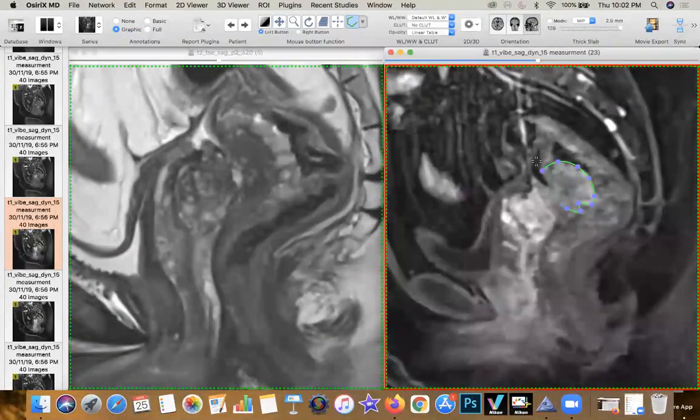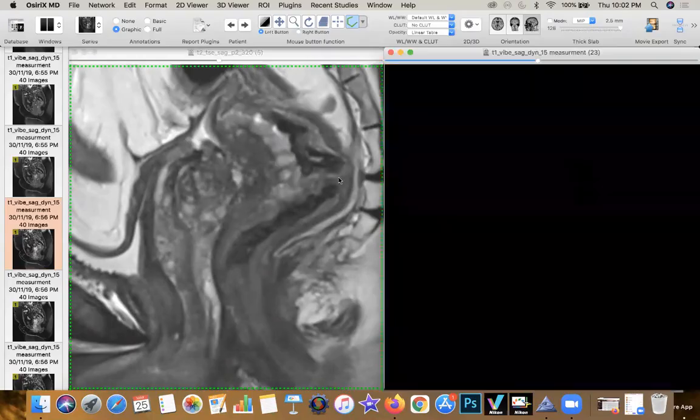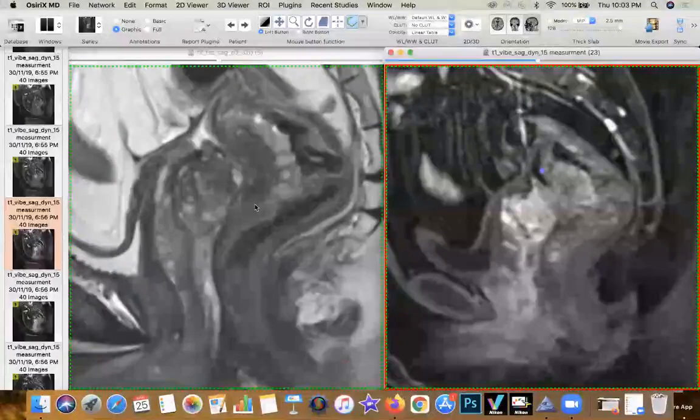That's the lesion in the rectal wall. It's breached the mucosa and the muscle layer and is producing the typical appearance. And you can see overlying that full thickness muscle invasion and some degree of mucosal involvement, the hypertrophied mucosal lining wrapping over that, because that's how much inflammation endometriosis produces.